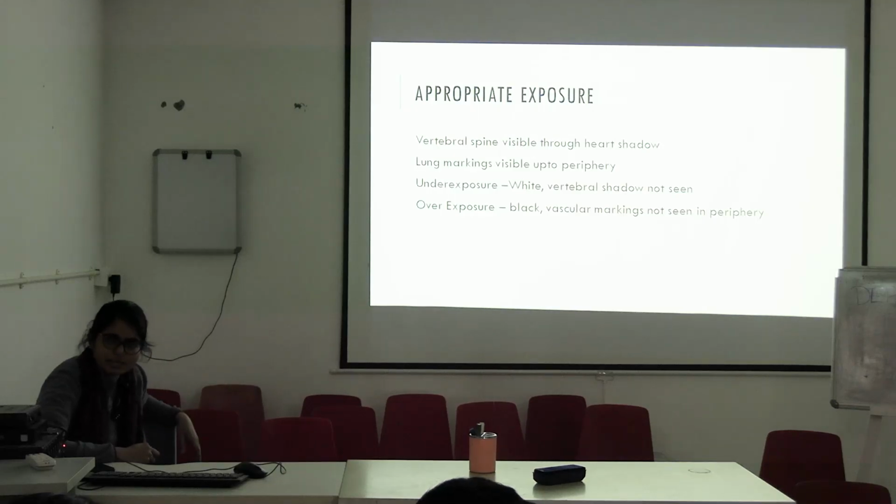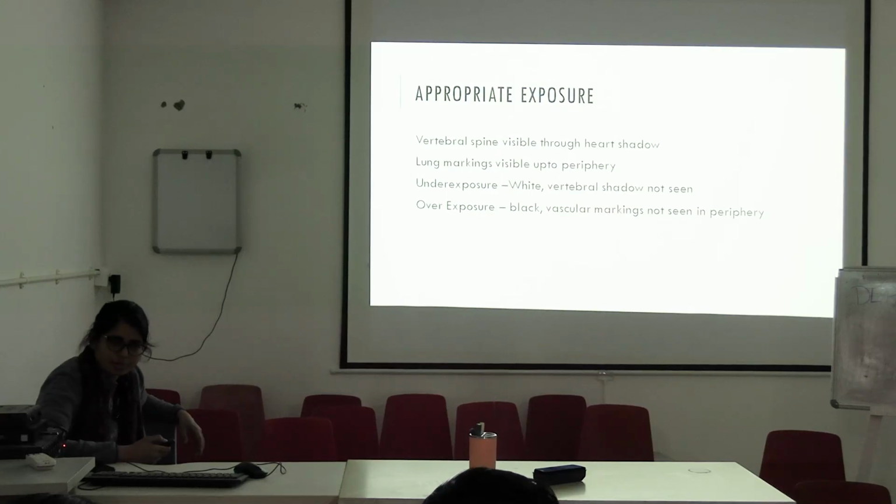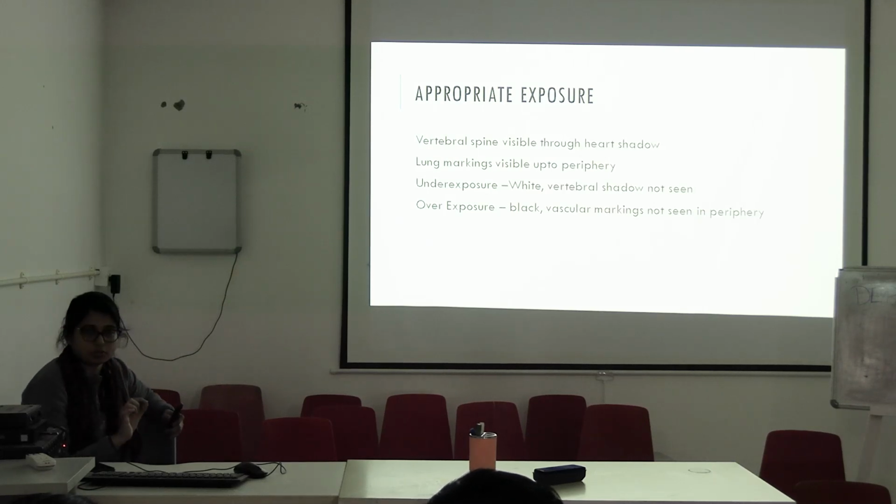There are some pathological conditions also when the bronchovascular markings are prominent, like in bronchopneumonia, in any reactive airway disease or in viral pneumonia. The bronchovascular markings will be prominent, but those are pathological. But physiologically also, if we are seeing the prominent normal bronchovascular markings, it means the exposure is good, okay.